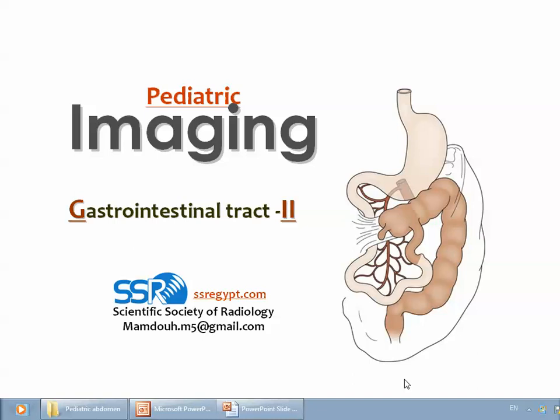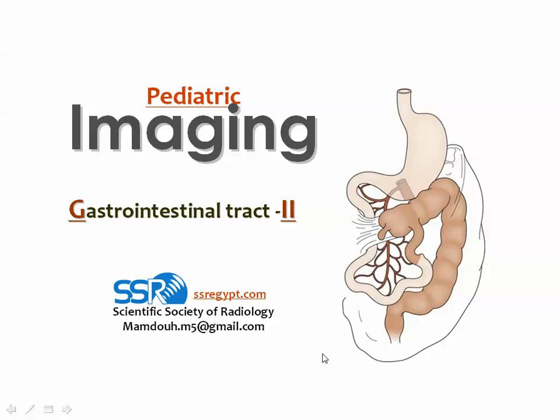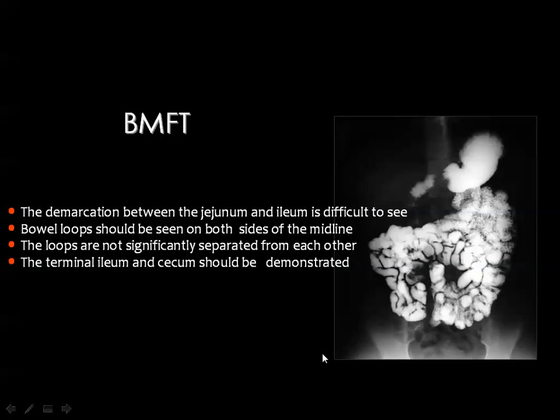Dear colleagues, now we will discuss the second part of the pediatric gastrointestinal imaging. We have finished the first part with the lesions of the esophagus, and we also discussed gastric abnormalities. Now we'll continue with the small and large bowel diseases.